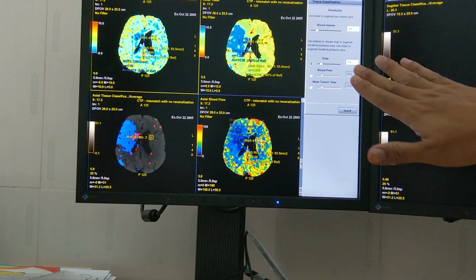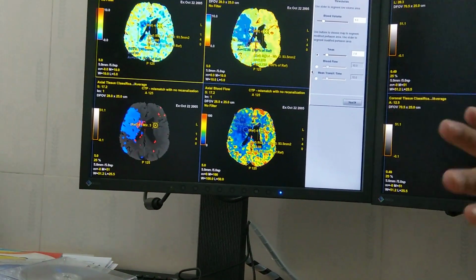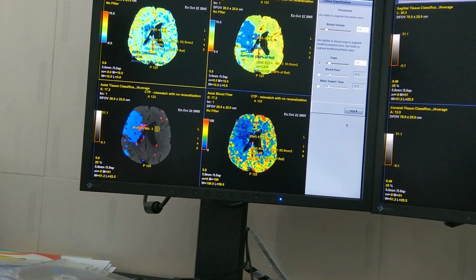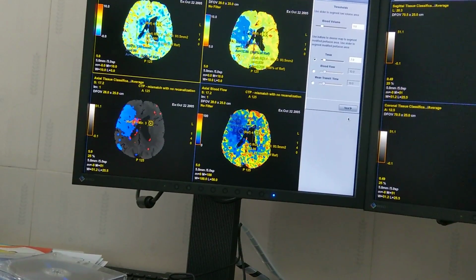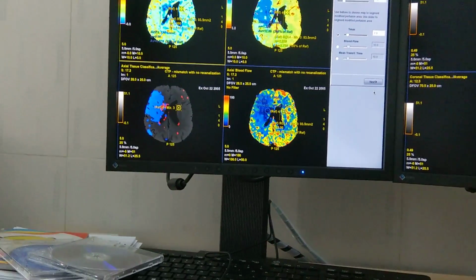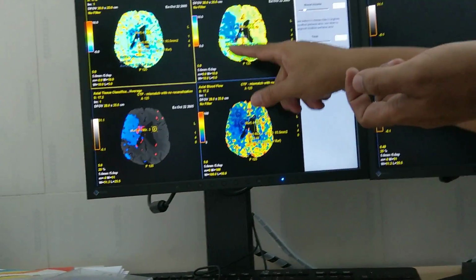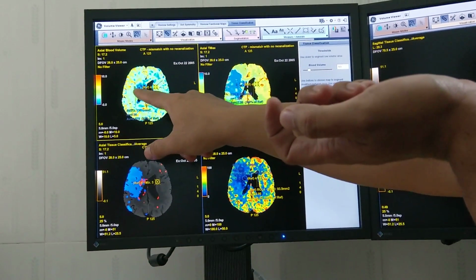This one you can choose which one you want to use, but I will suggest don't change. Use what GE uses. Nghĩa là mọi người có thể thay đổi thông số này để điều chỉnh T-max, nhưng đây là reference tham chiếu của GE. Theo khuyến cáo là không nên đổi. Em cũng khuyến cáo mọi người không nên đổi. Why? Because if you look at T-max, it's easy to see the area, and you can minus, easy to see. This one minus this one, easy.